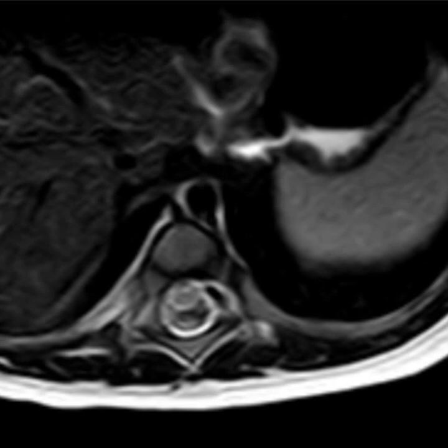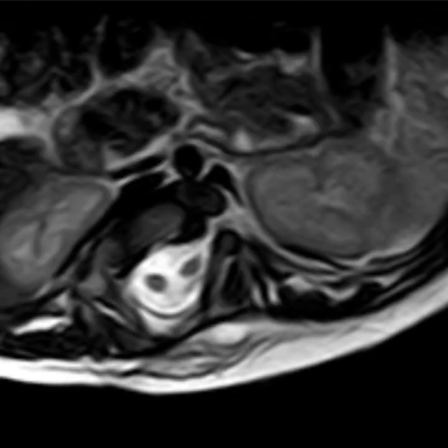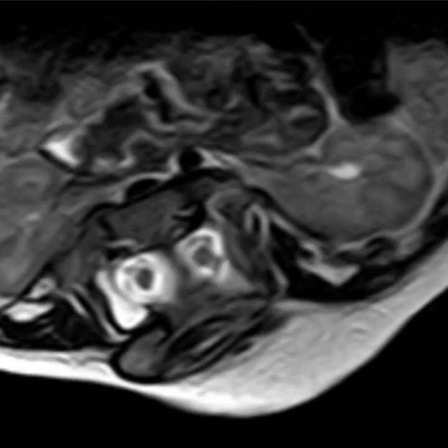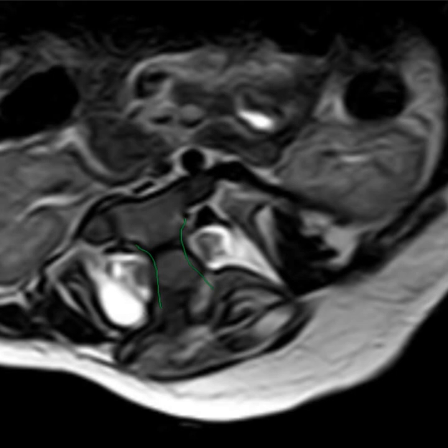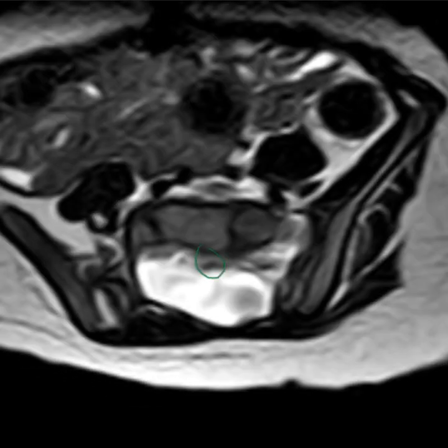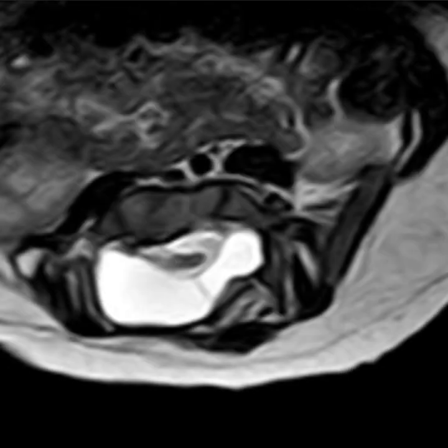And if we go to the axial T2 weighted images starting from top to bottom, here we can see, obviously, there's diastematomyelia. We can see that the spinal cord is split in two. There are two spinal cords here splitting and going into two different dural sacs, and they're separated by this structure, which is obviously a bony spur. So there's a bony spur dividing the thecal sac into two thecal sacs with two spinal cords, and as they go down, they are tethered to the level of, I think, S1, and associated with reunion of both dural sacs, resulting in the dural ectasia.